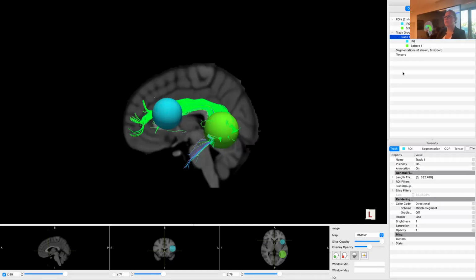If you look around a little bit to your neighbors, you can already see the variability that there is. We're all dissecting the same brain, but we have very different dissections. You need to do a couple before you're reliable. So don't expect to just fire up the software and be reliable. You can see the variance that we have. Okay, so save, and then we're going to do some housekeeping if my computer lets me.